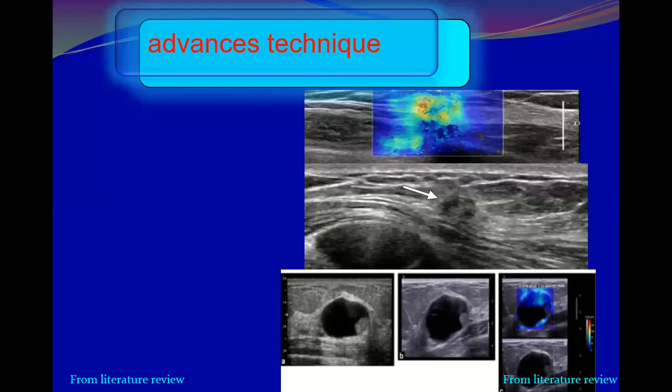Coming back to how you evaluate the lesion. How are you going to evaluate? Shear wave elastography. Excellent, well done. Why is it shear wave? Because in gray scale it represents a suspicious lesion. And in the elastography it is not red, it is blue, and blue represents a hard component of the lesion. So it is shear wave elastography.